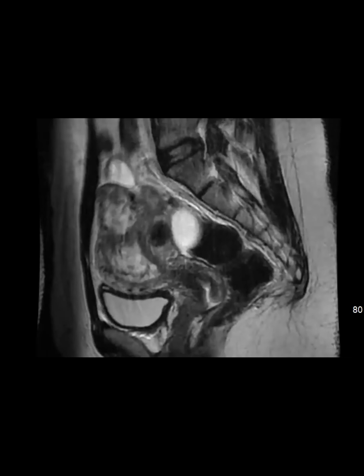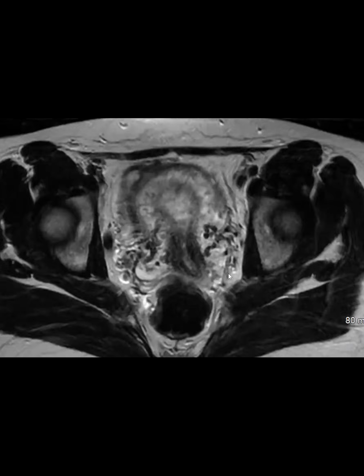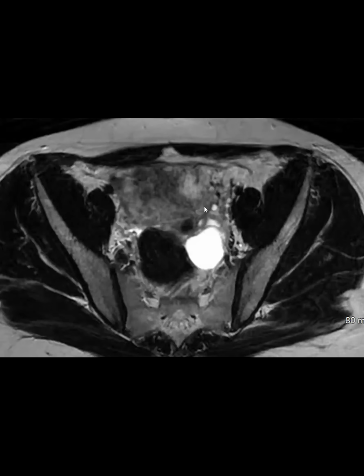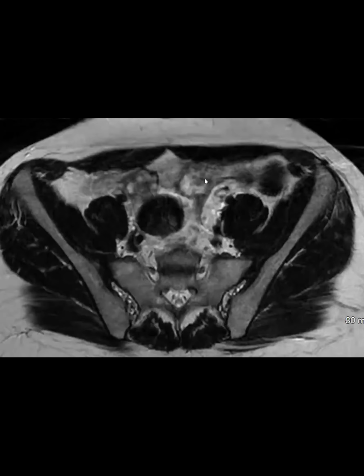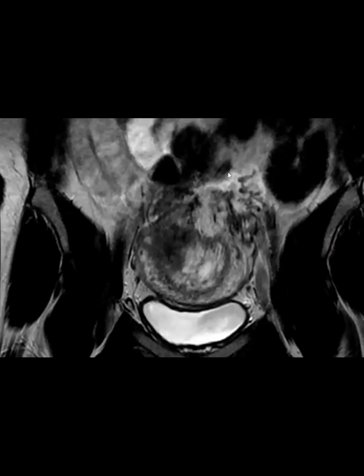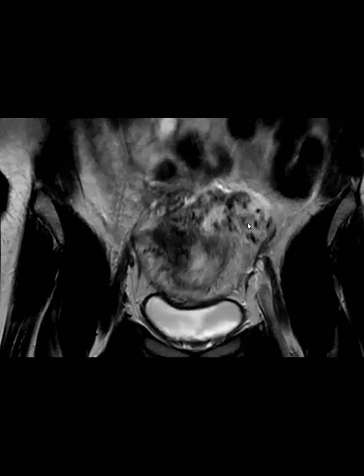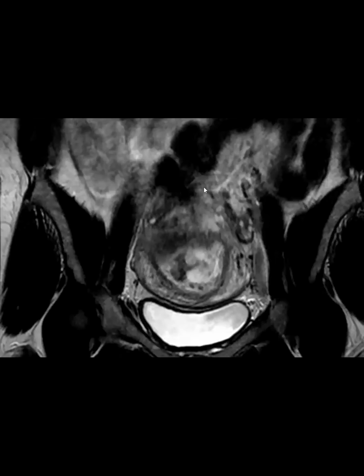And then, I was like, why could this not be an ectopic gestation in the cornua or interstitium? And so when we re-looked at these images from that perspective, you notice that this is a predominantly T2 hyperintense structure here, and there are increased vessels in the left adnexa. I think you can see them better in the coronal plane. So if you go back to the coronal plane, there is increased vascularity towards the left cornua, so to speak. And so we raised the possibility that this might be an interstitial ectopic gestation.